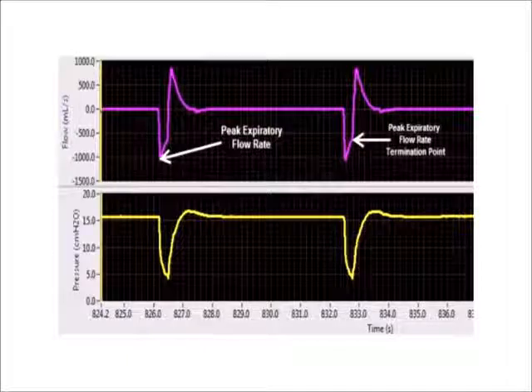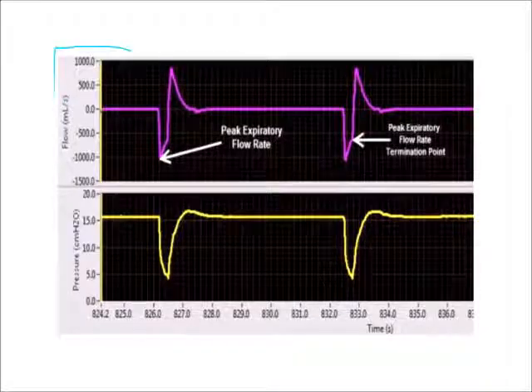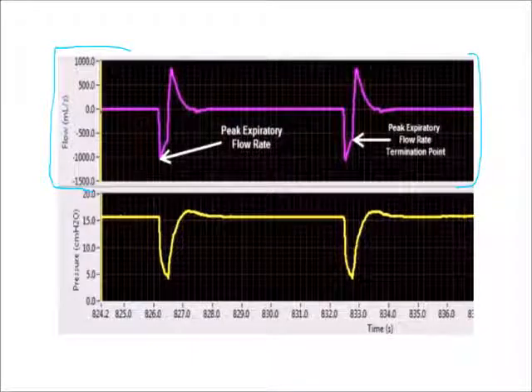Setting T low based on the expiratory flow waveform. Now, this is a screenshot of just the waveforms of a ventilator screen, and we're going to look at the flow waveform here in purple, just to get some definitions.